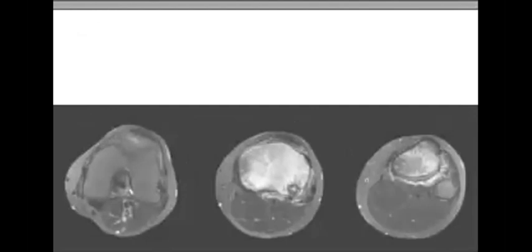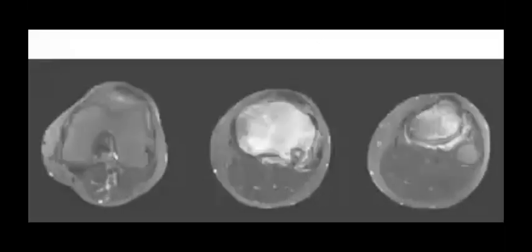And yeah, so that's why the infection will be one of the good differentials for this case. Marrow edema, sclerotic rim, but maybe as you see, the CT will be more helpful here. And yeah, there is some soft tissue reaction, but if we go to the contrast, we will not find soft tissue mass, no enhancing soft tissue masses. Maybe some edema in the surrounding soft tissue, but no soft tissue mass. Yeah, perfect.